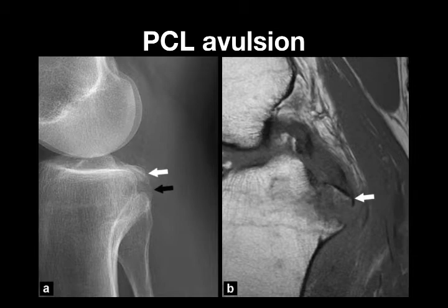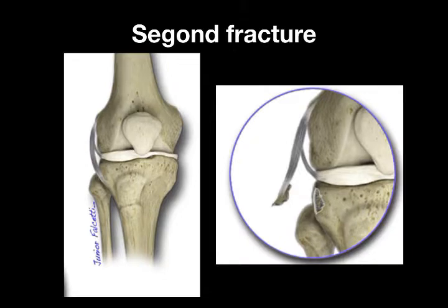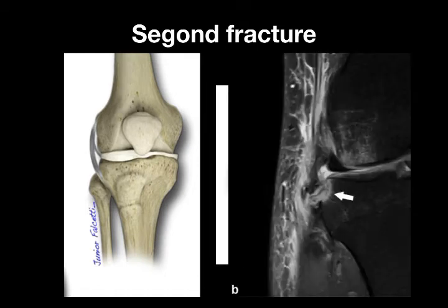the intra-articular surface. Another very interesting and historical avulsion fracture is the Segond fracture, first described in 1879 by Paul Segond, and the etiology of this avulsion fracture is controversial. There have been various etiologies proposed for the Segond fracture. Some say this is because of avulsion fracture of the lateral capsular ligament. Some say it is because of avulsion fracture of deep fibers of the iliotibial band. Nowadays, it is considered to be the avulsion fracture of the anterolateral ligament, a new ligament in the knee. These are MRI pictures showing the same avulsion fracture because of avulsion of the anterolateral ligament.